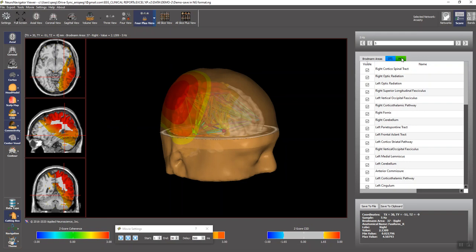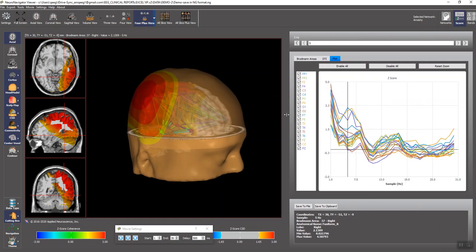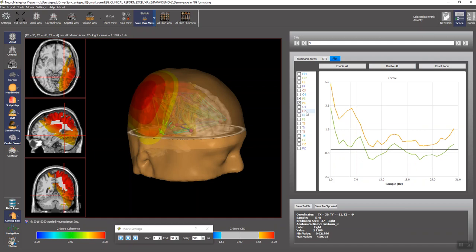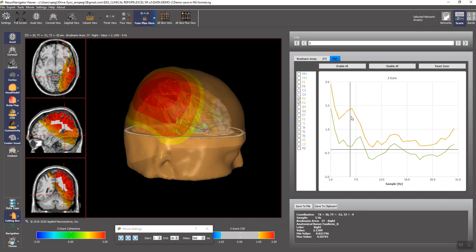And now what we have is a plot of the dynamic FFT, the same as in the NeuroGuide that you can see in NeuroGuide, and when you click View Dynamic FFT. But now we have it inside of the NeuroNavigator. You have the ability to disable all, and then let's say we just look at parietal lobes, left and right. This individual was struck on the right side, has damage to the right parietal region, and you can see that difference between left and right parietal.